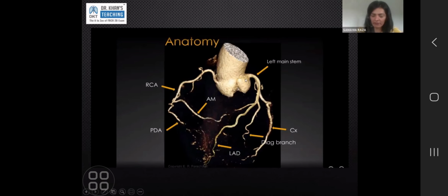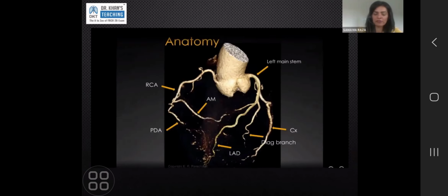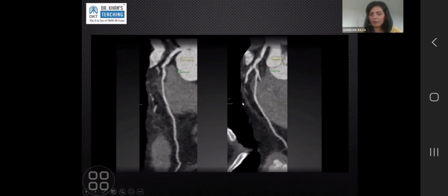This is not a diagnostic image. It can be very blurry if the scan isn't good quality. That shouldn't scare you from the scan, because the actual scan being reasonable or diagnostic quality is still pretty high. This is just a rough guide, basically. This is the image when we click on a certain vessel. If this was in front of you and you brought the cursor there and clicked on a certain vessel, this is what it would give you. Depending on the software you're using, you swing it around to see how it looks in different planes.